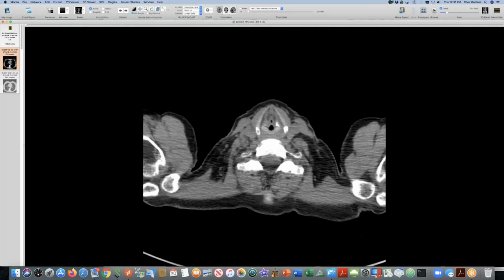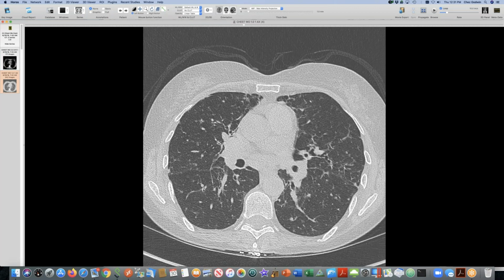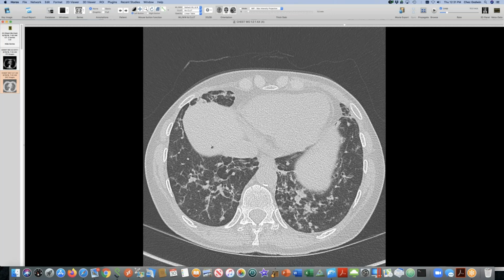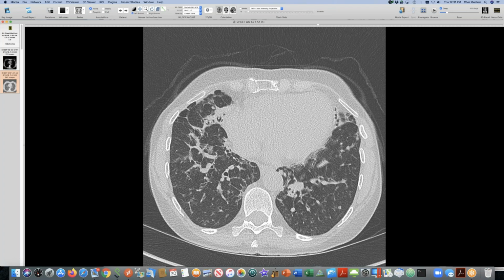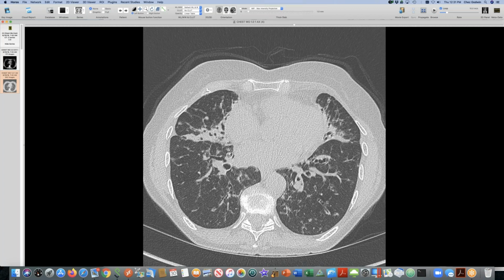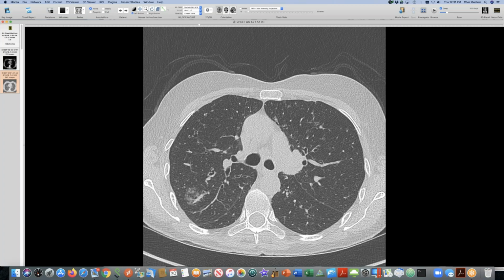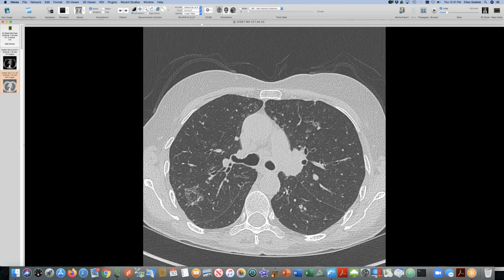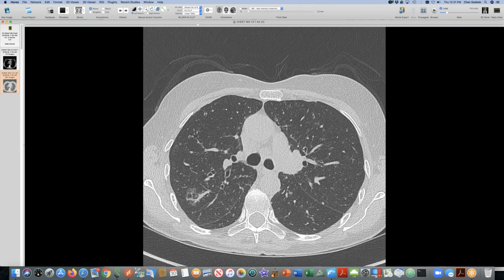All right. And then I think I'm going to be able to bring up another case here. Yes, indeed. So here's a person who has an immune deficiency. So this is an acquired immune deficiency, and this person has a lot of airways disease, as you can see, and most of the nodules that we see are really associated with airway. So they're blobs within the airway or they're inflammation around the airway. And then this person also started to show up at varying times with these faint ground glassy abnormalities like this. And people were concerned with this CVID diagnosis that there is a potential for developing lymphoma.